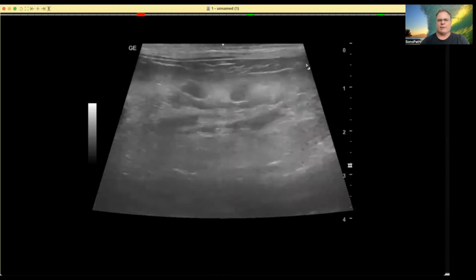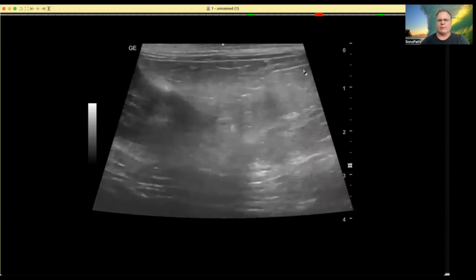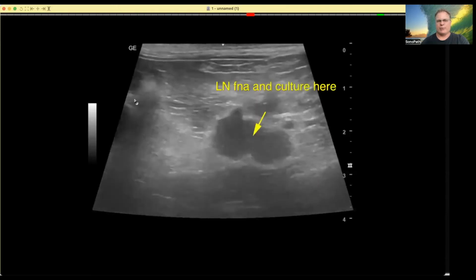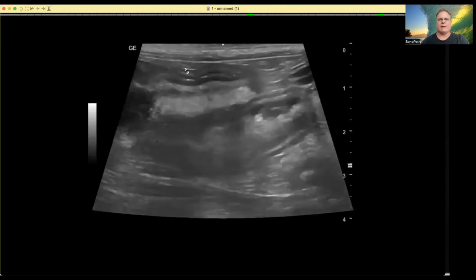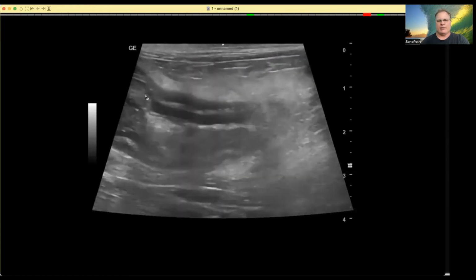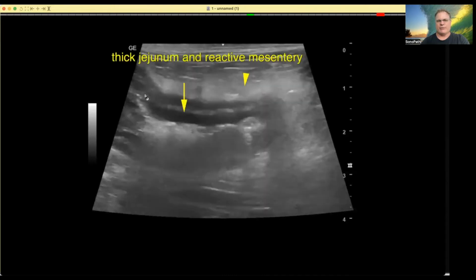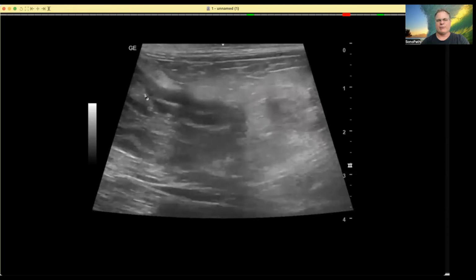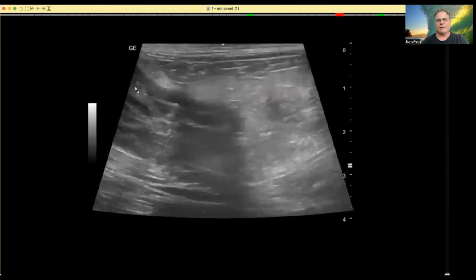And up here in the corner, you see some pretty normal small intestine. Curvilinear patterns are okay, but you have this portion of jejunum that's really thickened. I'm going to stop this video just a second. Everybody asks me, well, is it cancer? Is it not a cancer? Well, this one's approaching neoplastic criteria. That is, we're starting to lose mural detail in this area.